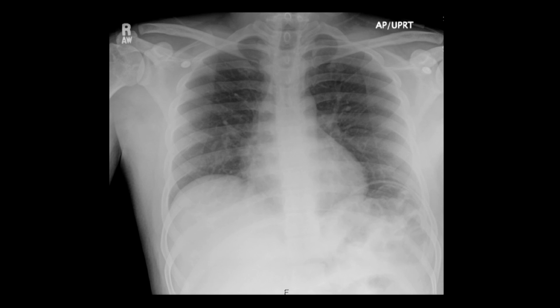In this patient, this was probably a patient presenting with abdominal pain. As you can see, it's an erect chest x-ray, and so you want to look carefully below the hemidiaphragm in these patients. You can see that we've got gas outlining the undersurface of the diaphragm, and you can see it outlining the underlying structures, probably the folds of the stomach here. And so this is compatible with free air, and the patient obviously has something going on in their abdomen that will require more investigation.